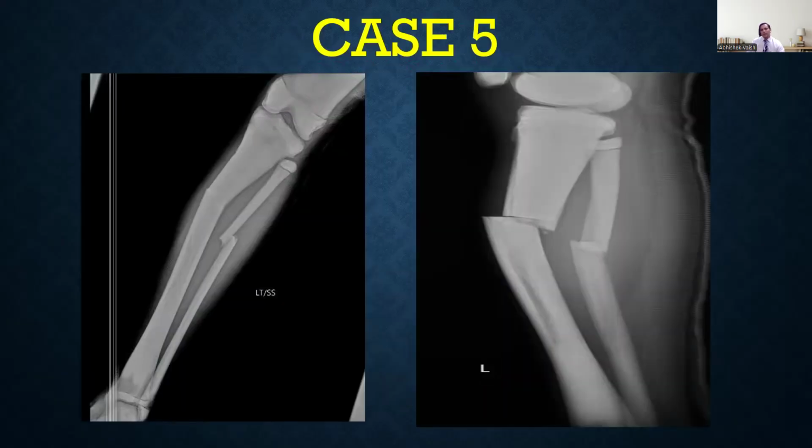So another case, this is a 15-year-old boy, whose bones you can see. They are not normal looking, because you already know the normal anatomy. That is why it is important to know the normal anatomy. And you can see the physes have still not fused. The bone is white, completely white. It should not be like that. There is no cortico-medullary differentiation. The cortices and the medulla are one. It looks like marble, and the fracture is like you have broken a marble slate.